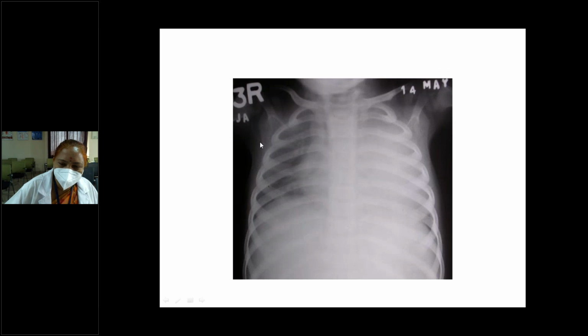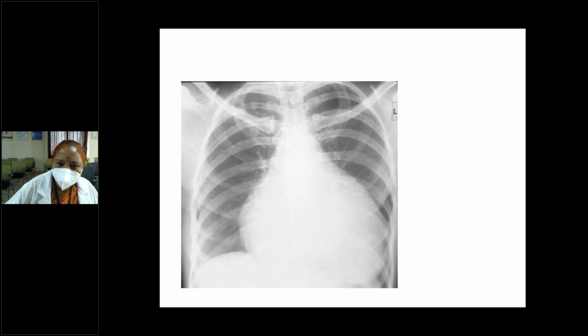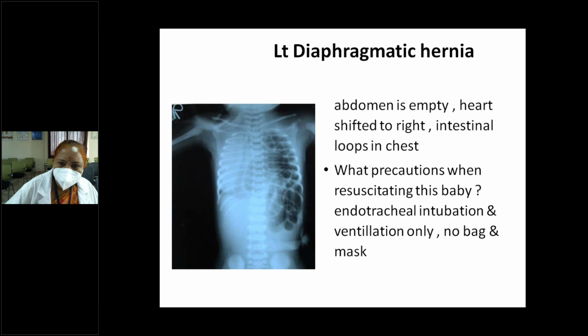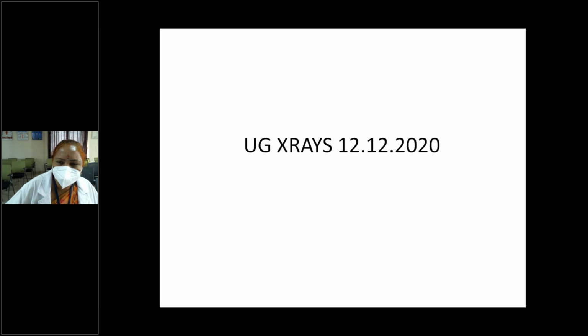These were all covered in the previous class, so I'm skipping them. So from today, from this X-ray, okay.